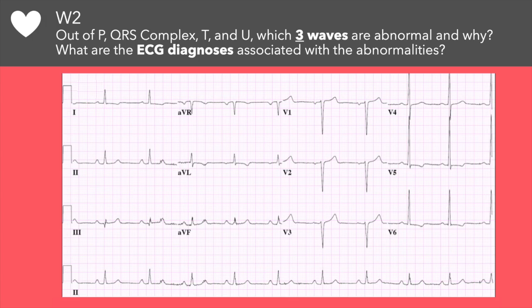Let's start with the P. The P wave is wide. Look at that width of that P wave. Pretty wide here. This is consistent with left atrial enlargement. We can even see a bit of a notching pattern in lead 2. Looking at the QRS, it's also pretty high in magnitude in V1 and V6. Adding those 2 together is greater than 7 large boxes, so that's LVH.